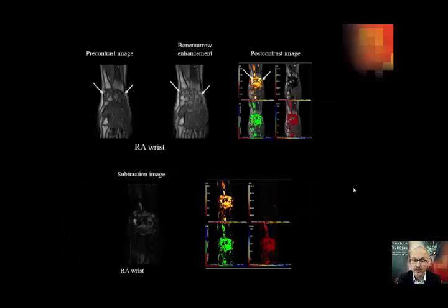Another thing that you can use if you don't do dynamic MRI images or only do pre and post contrast is that with the built-in movement correction, you can have more robust subtraction images. And from the subtraction images, you can again get a volume of enhancing voxels.